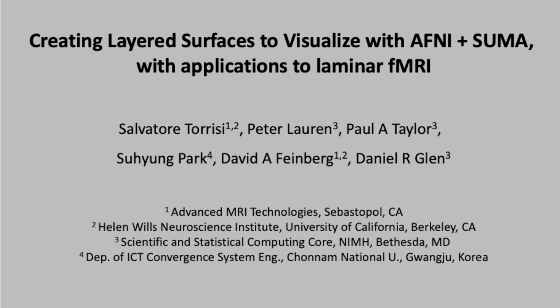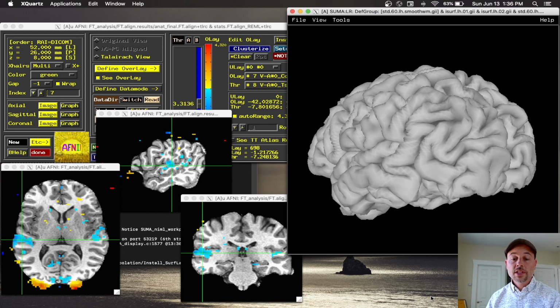This video explores some new features for investigating datasets in AFNI and SUMA, which could be useful for layer fMRI. These include new SUMA clipping plane functionality, as well as the surf layers and QuickSpec SL scripts we demonstrate across 3 datasets.